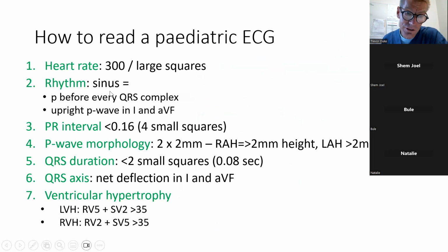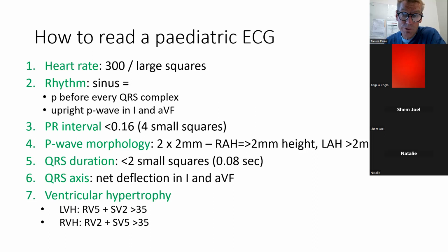The next thing you need to do is decide whether the heart's in sinus rhythm or not. And we sometimes get a good idea of that from just feeling the pulses. When you're feeling the pulse of a patient who's in sinus rhythm, you should feel a regular pulsation. It doesn't guarantee the child's in sinus rhythm, but it probably means the child's not in atrial fibrillation, where you feel an irregular pulse, both in time and in rate and in volume.